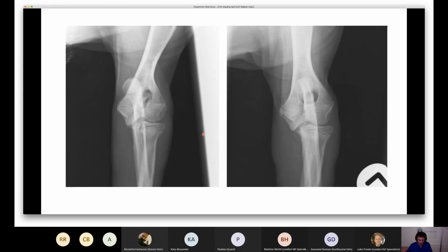So when we're talking about bone and we're talking about generalized lucencies, it sort of implies lysis. And when you start talking about bone lysis, it essentially implies that there's an aggressive bone lesion. And you know, in this 6-month-old dog, that isn't really where we're going.